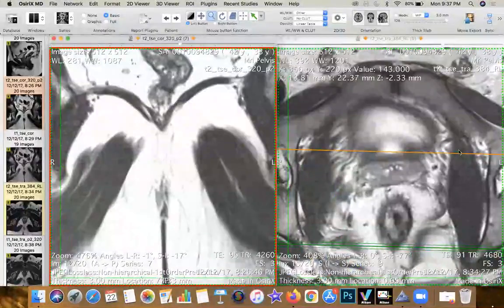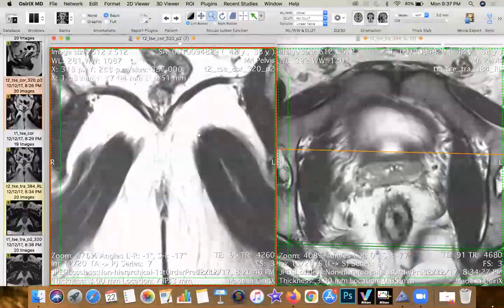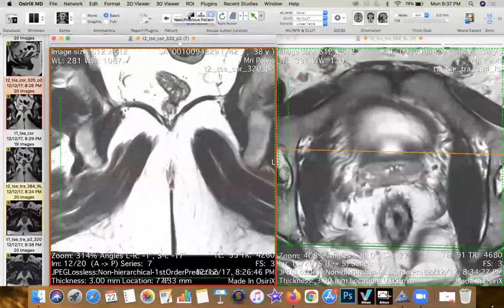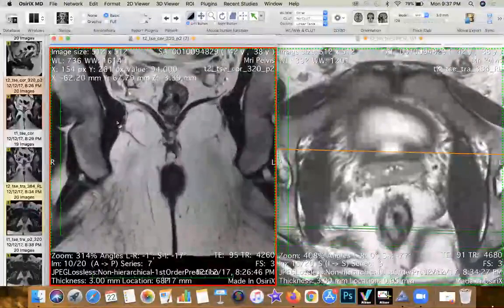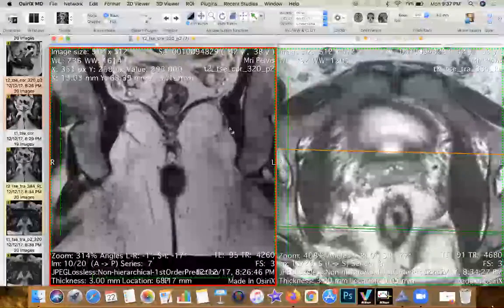Whenever you're looking at the levator ani, always look at the obturator internus itself. You would always find that the lateral aspect of the levator ani muscle goes all the way to the edge and meets up onto the condensation seen over the obturator internus muscle.